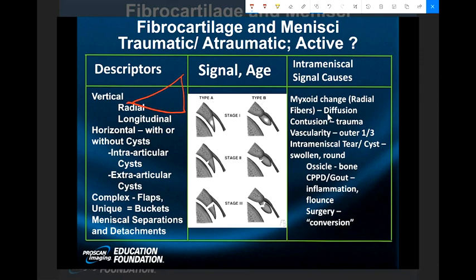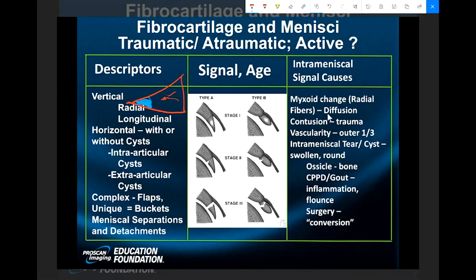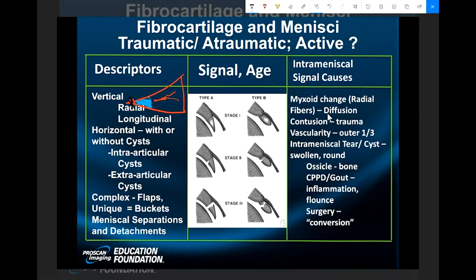So now you have normal signal here. And then you also, with that, had some nasty tear. Let's say it was a radial tear. And the surgeon was pretty aggressive, lady or gentleman, and so they went in there with their scalpel and they did this. They just wiped it out. They just cut it, and they said, oh, yeah, it's still bad. Still looks bad. Oh, it's still bad. Now it looks pretty good. I'll stop.